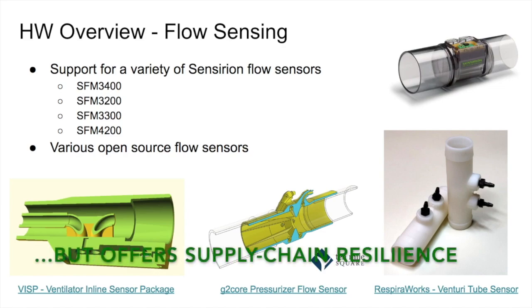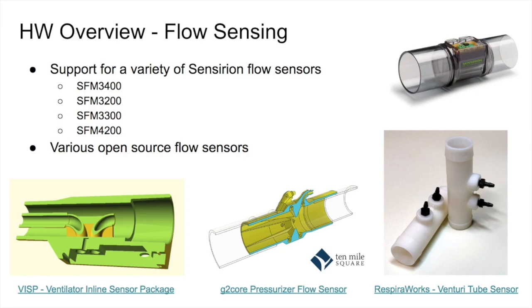Currently, VentMon supports a variety of Sensirion flow sensors. These were heavily limited early on in the pandemic, since many manufacturers used them in commercial ventilators. However, that supply chain pressure has been alleviated somewhat, and it's now a more stable resource.